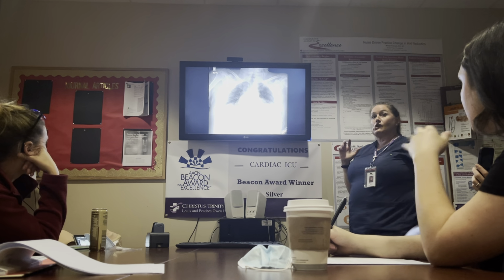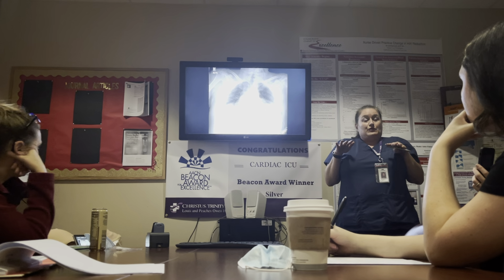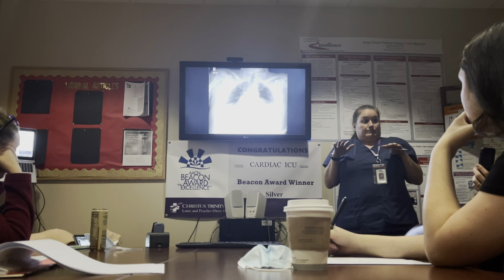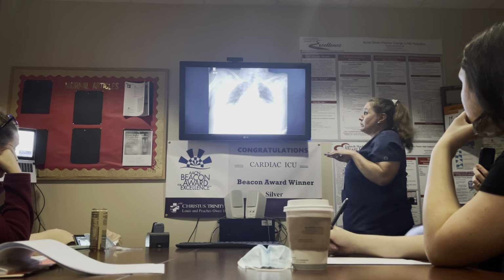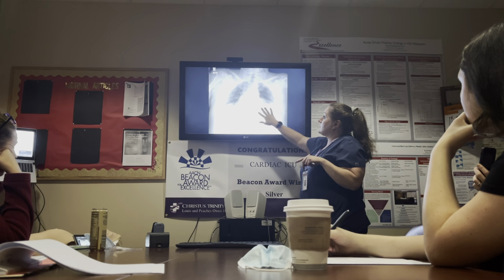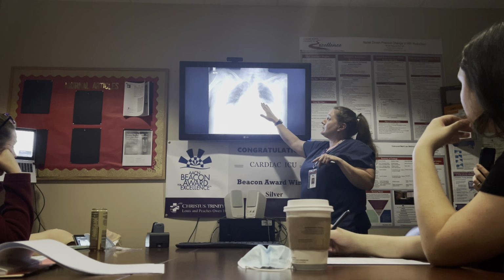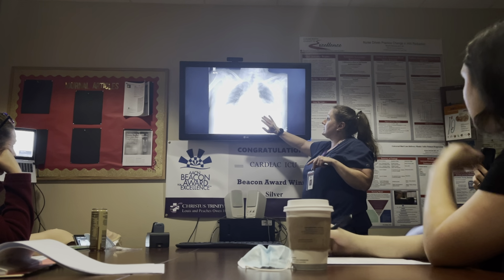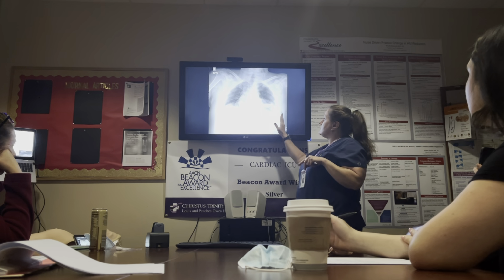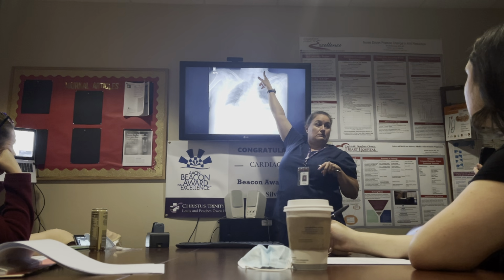Cardiac silhouette's a little large, but that, again, is because when you decrease the volume that you're ventilating, and this is an AP film, your cardiac silhouette's going to be a little bit larger. They've got a chest tube here, okay? They've got something going on in this part of the lung, so you don't see crisp, clear areas of the cardiac silhouette on the left-hand side here. Their diaphragm border, however, is pretty clear. The other thing you see is they've got sub-Q emphysema, and they've also got sub-Q emphysema up here, okay?